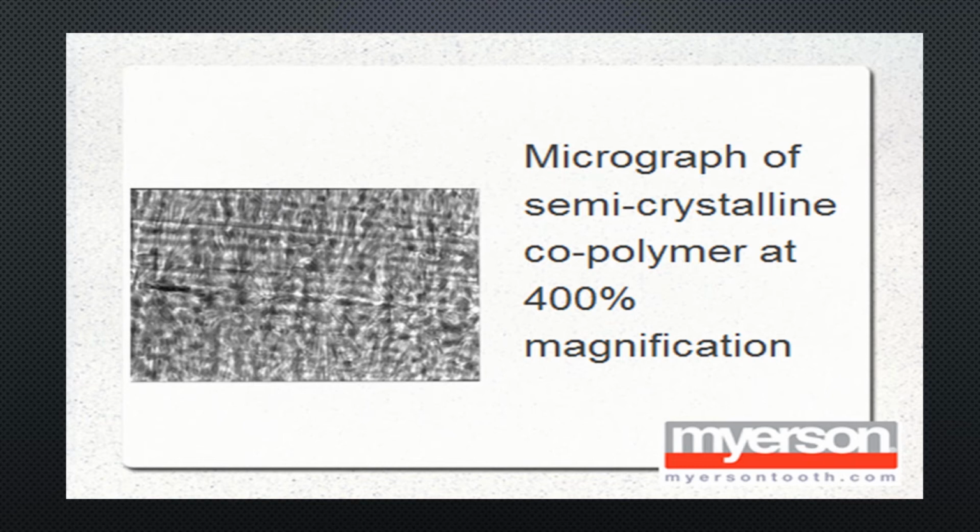And that's also why a lot of the nylon materials, like those other clear materials, are very difficult to mill. You definitely have to have a wet mill, and even in that instance, spindle speeds are slower and you have to deal with basically melting the material from the friction. This material, you don't have that, and it actually grinds really, really nicely. Here's a couple of tests we did.